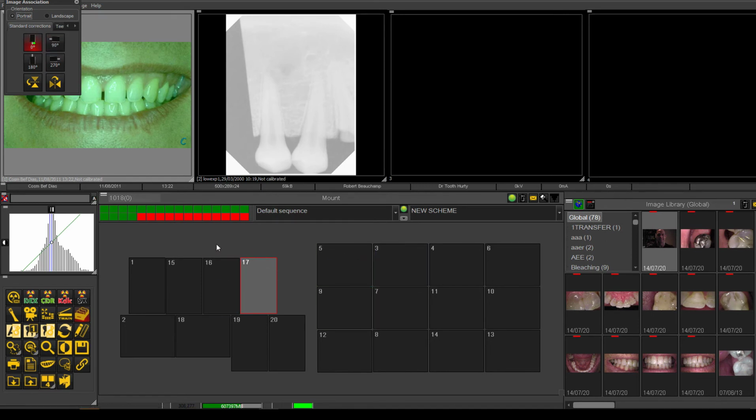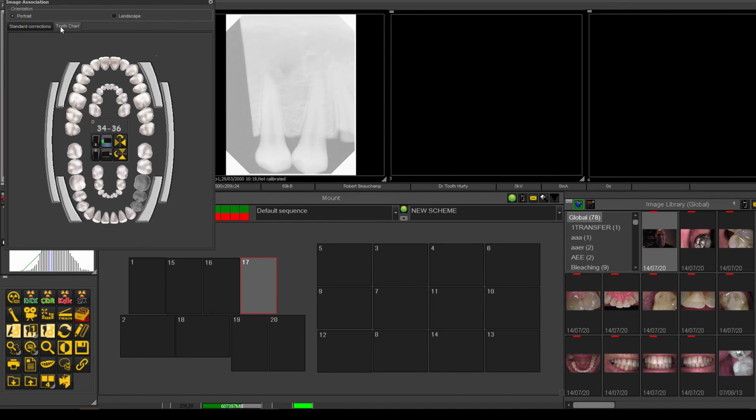So this is where if you know what type of images you're going to be taking, as an example, a digital SLR camera, and you know that you're going to be taking, I don't know, a shot vertically because you like the length of that vertical shot for a full face, well, you can program the image to be rotated in the right orientation automatically by the software, okay? So this is where you can program the box to have a certain orientation, to flip it vertically, flip it horizontally, etc.